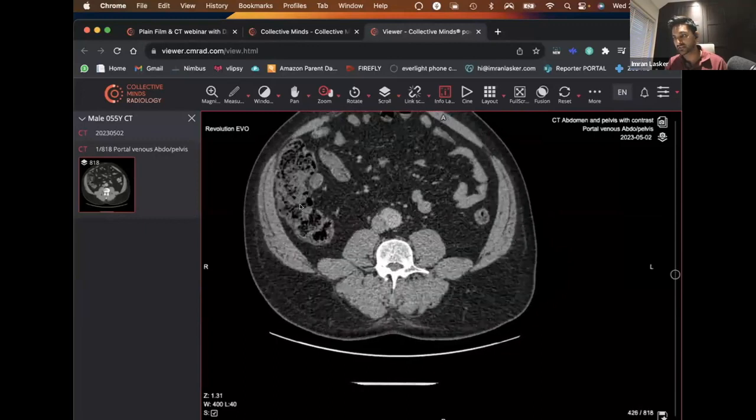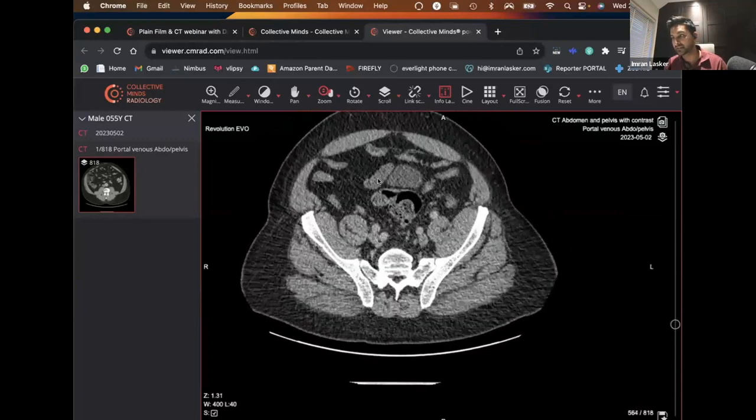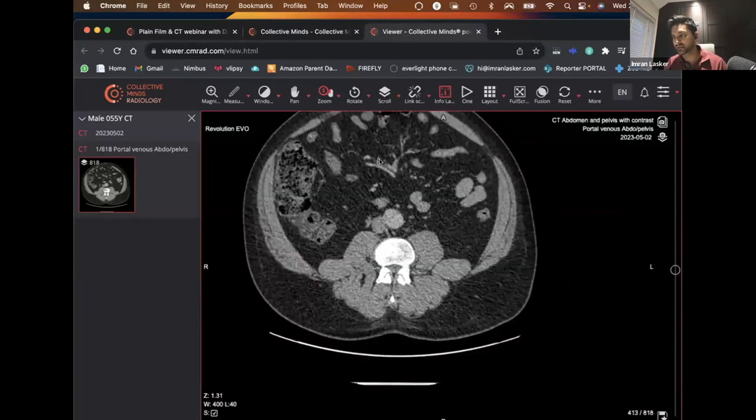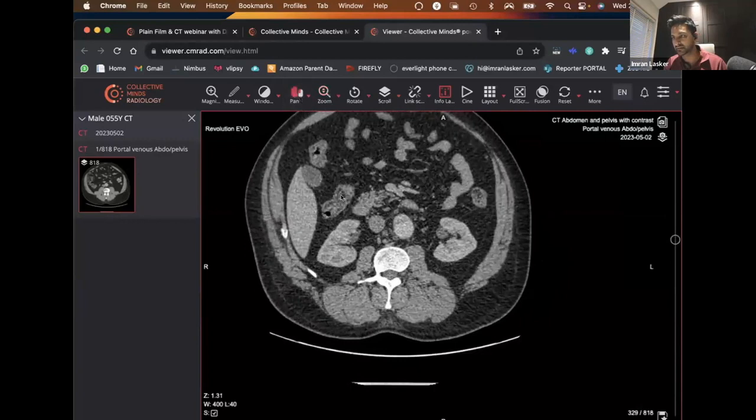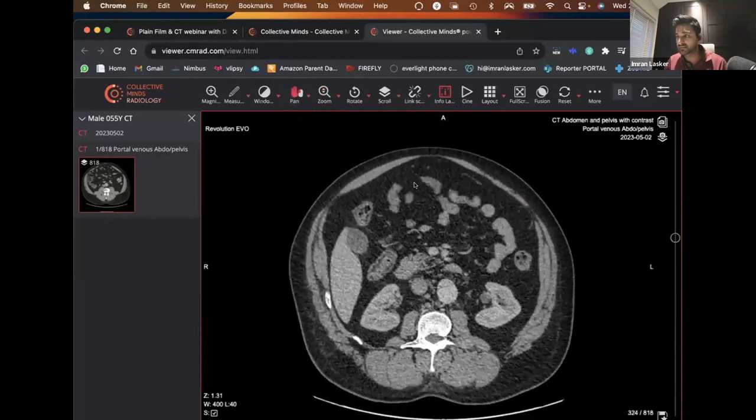Coming down to this area over here where the cecal pole is, everything looks okay. And then I keep a cursory eye down the middle of the abdomen just to make sure the small bowel doesn't look particularly inflamed either. So I know that part of the body is okay.